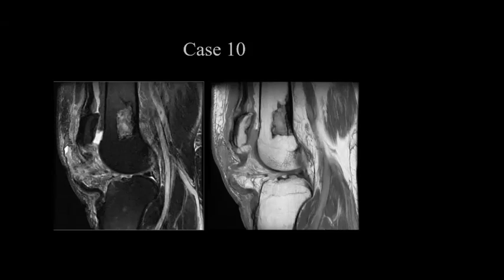عندنا two selected MRI section, sagittal view T2 fat sat and T1.